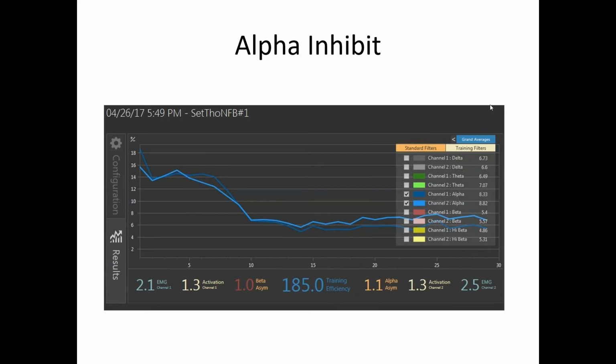Okay. So the parameters, the conversion, the general trend in amplitudes and so forth, they are actually unique because on the trend screen we see a dynamic process, the client over a period of time. What I really like is Rob's way of taking screenshots of several sessions, so we can compare what happened previously. How was the conversion previously? How was the conversion 10 sessions ago?